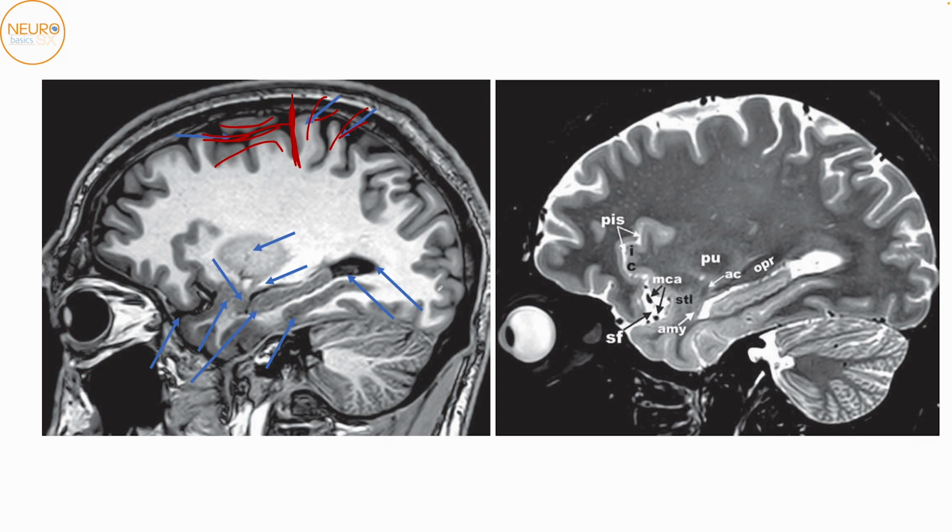Okay. Then, apart from that, we're able to make out the atrium of the lateral ventricle now with its choroid plexus. Apart from this, very strange, long gray matter running along the temporal horn. So this is your hippocampus running within the temporal horn. This here is your collateral sulcus. Apart from that, here we have the Sylvian fissure. Just the gray matter which connects to the head of the hippocampus is the amygdala, located over here.